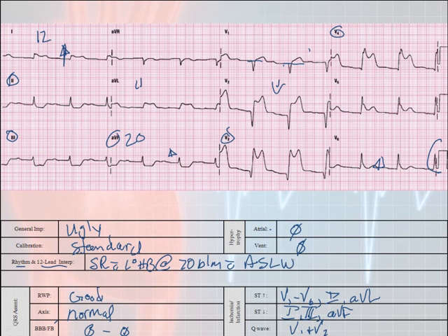Anteroseptal lateral wall MI. Do I have any depression? Yes, I do. I have depression in the inferior leads. Anteroseptal lateral wall MI with reciprocal changes in the inferior leads.